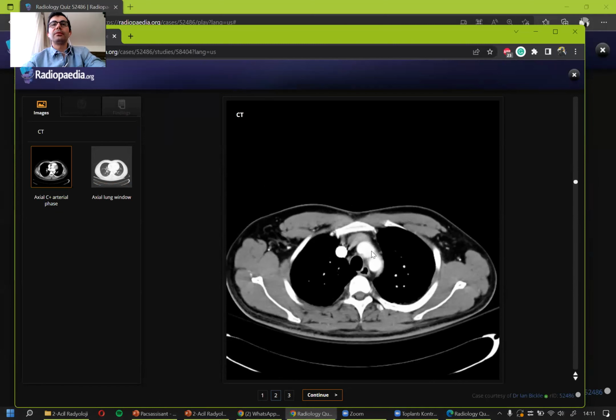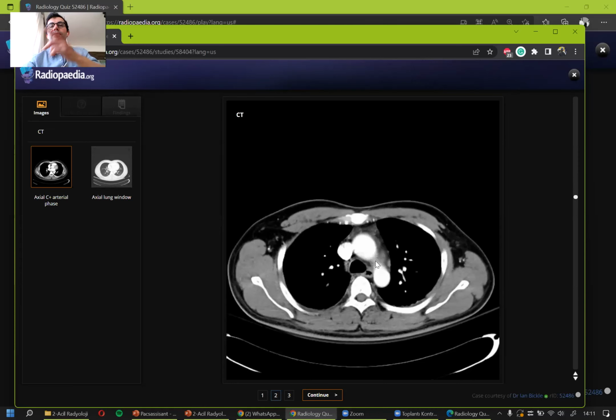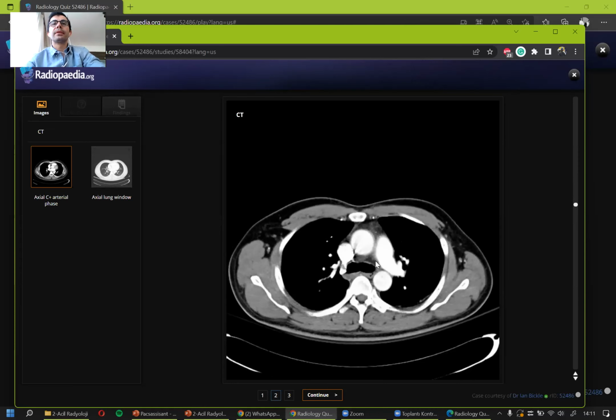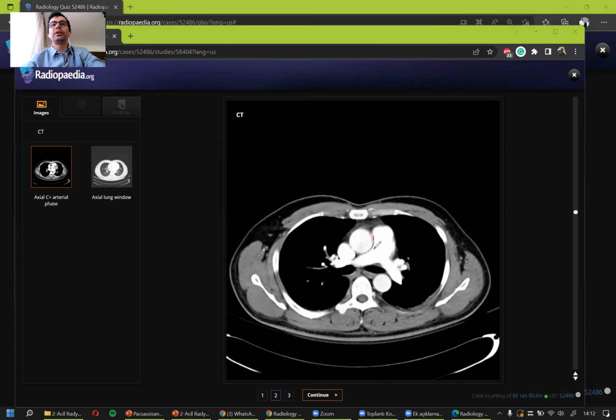I'm going down, following the trachea. I started seeing the arcus aorta, right? Which will take a sharp turn in the upper thorax. And as I go down, I started seeing the pulmonary trunk. The main pulmonary trunk is this, and it divides into two, right and left. So there is a reverse Y or X appearance, very typical for pulmonary arteries. Please remember.